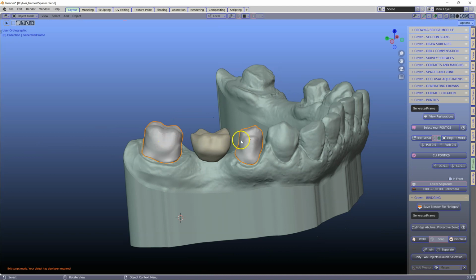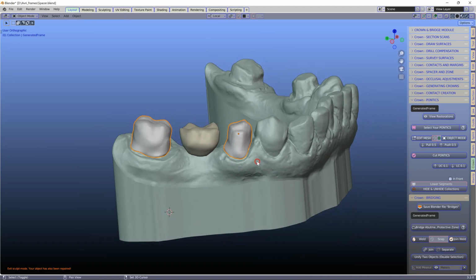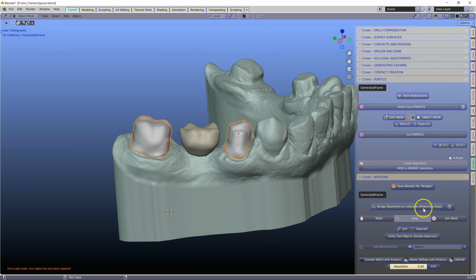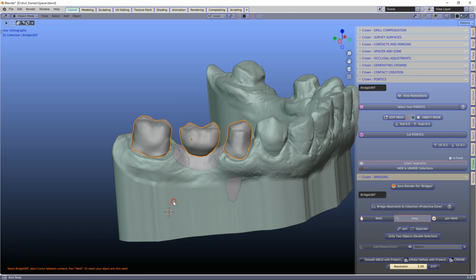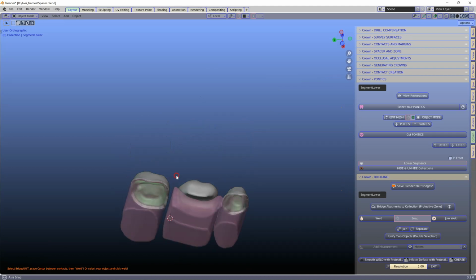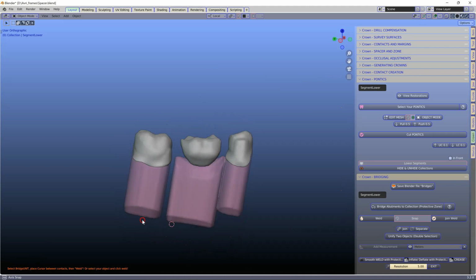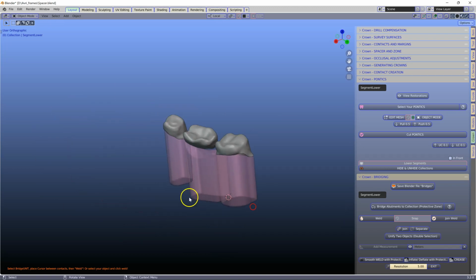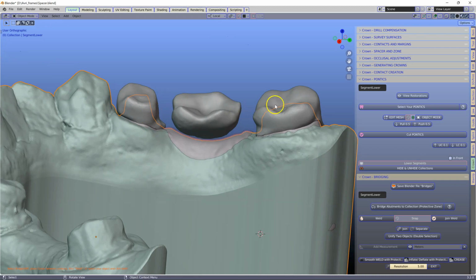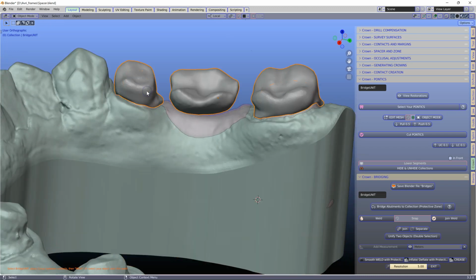Here select your components and we're going to create the necessary protection zones underneath it. So we're going to take all three of them and then make these zones. Now that we've got the protection, if you don't know what that is, I'll just demonstrate. It protects the inside of it. This means that any object which intersects into the crown will get deleted and it'll stay protected.